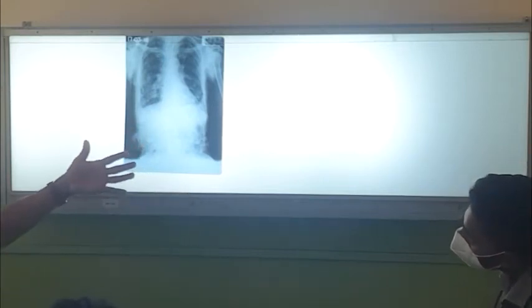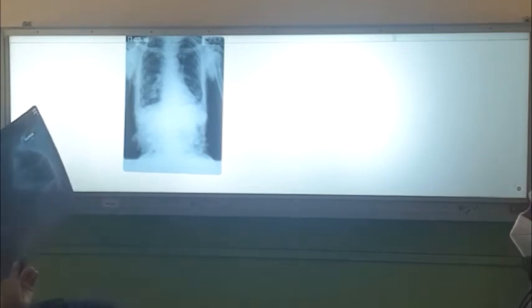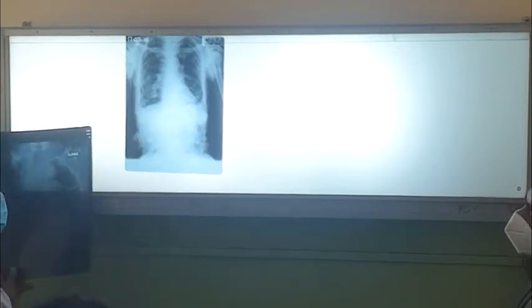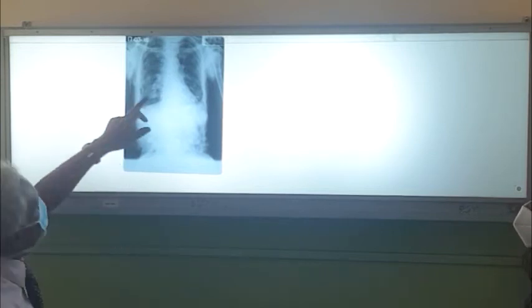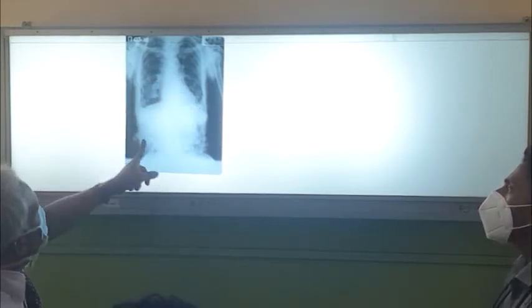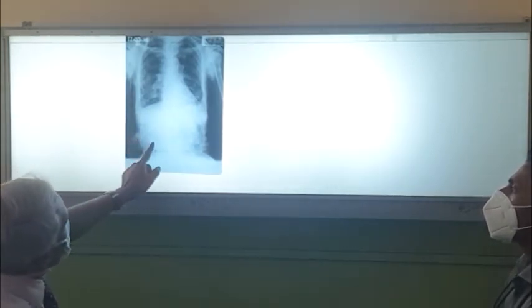These are spot cases for you, right? Sometimes you might get this. What is the diagnosis there? So that is why I am keeping these X-rays. What is the diagnosis? Oh, because you see rounded lesions there, here also. Neurofibromatosis, right? A neurofibromatosis patient can present with lung fibrosis. So it's pleural thickening, basal opacity suggesting lung fibrosis. Poor quality X-ray anyway, a thin patient, right? Everywhere you can see these pedunculated lesions.